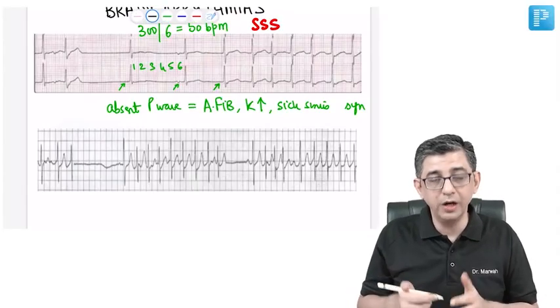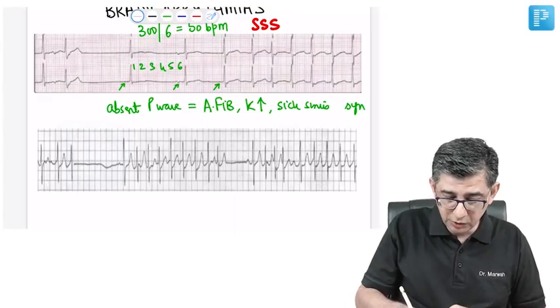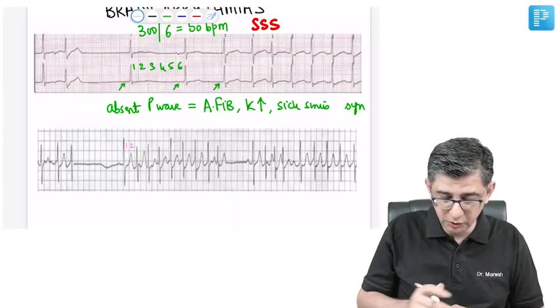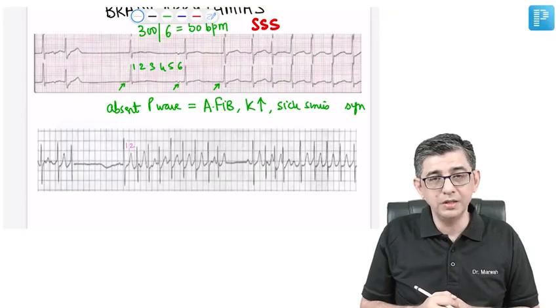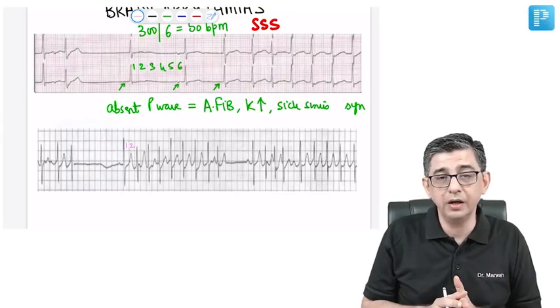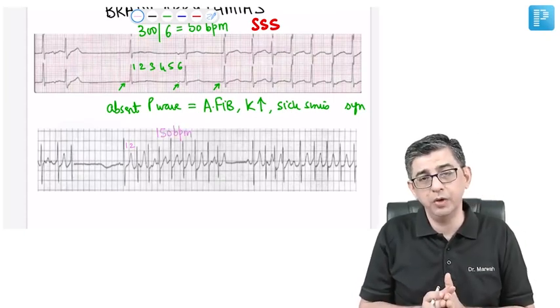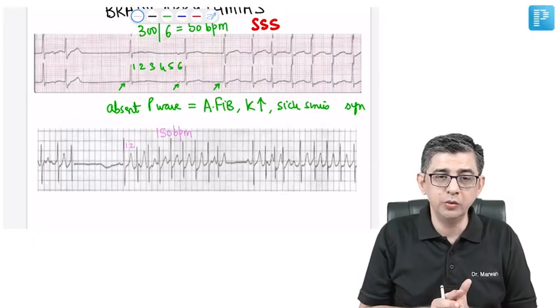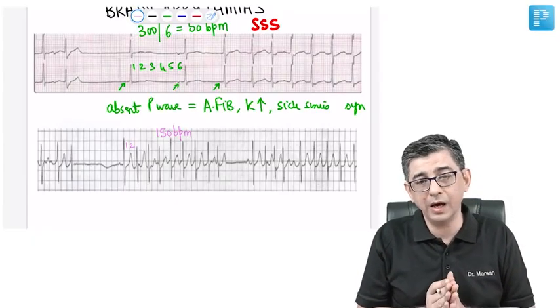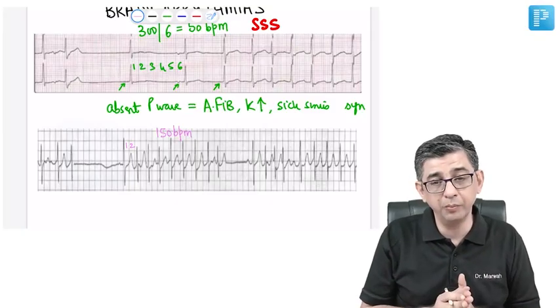First impression when you look at this would be that the RR interval of the patient is reduced. Most students, when they faced this MCQ, were totally zapped, because the strip showed tachycardia at the moment, since I'm not sure whether it's a tachyarrhythmia or a bradyarrhythmia, but because the heart rate is fast, most students said, sir, the initial impression of mine was that this person was having a tachyarrhythmia. And it looked like even a PSVT for some people.